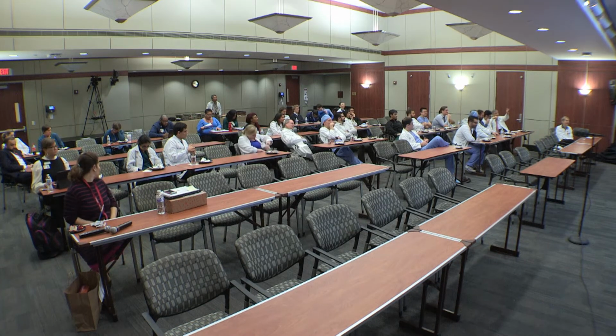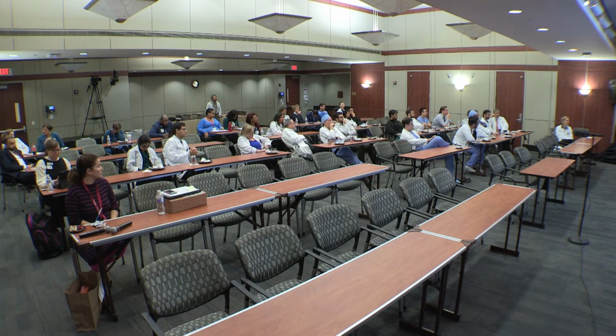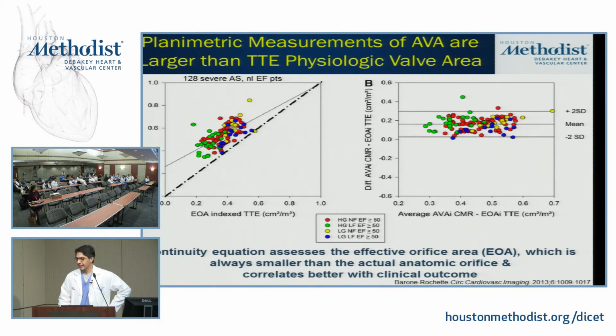This is a very important slide. Is this the same for CT too? Yes, absolutely, same for the CT. The skill is to be able to be at the leaflet tips and then make sure you identify your maximal systolic opening.